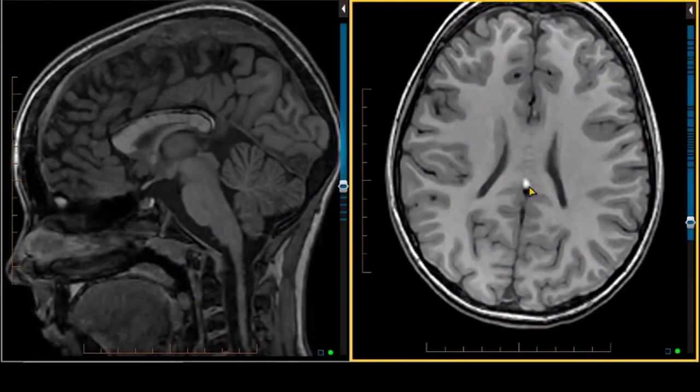This is an MRI in a 10-year-old child with headache, and we see an abnormality. We see an area of bright signal in the posterior aspect of the interhemispheric fissure. And on the sagittal T1 weighted image, we see along the superior aspect of the corpus callosum an area that is bright with adjacent hypointense signal. This sagittal T1 weighted image is performed with a gradient technique.